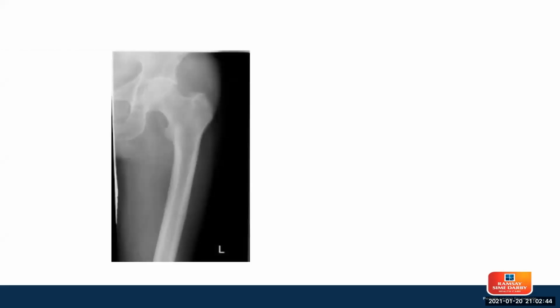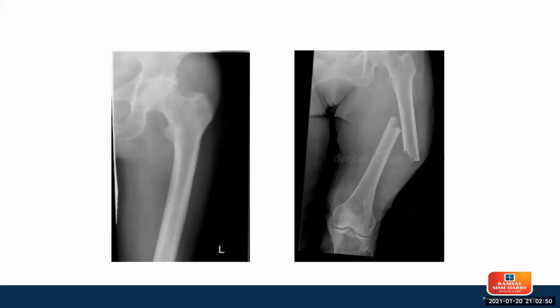All right, so this is a common X-ray. This is an X-ray of the left femur. It shows you the hip joint, and this shows the femur which is fractured. So currently you have identified a fracture on X-ray, and that is pretty much the talk for today. All right, thank you. This is quite straightforward. This one, I think I can identify a fracture.